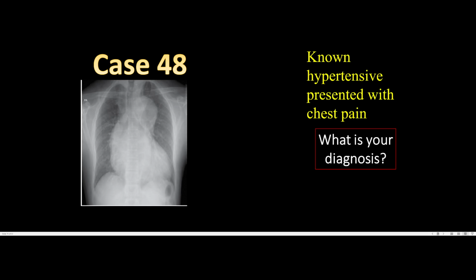So it's bleeding. You want to think of bleeding, something like aortic dissection. So in a known hypertensive patient presenting with chest pain radiating towards the back, with mediastinal widening, you might think of aortic dissection. You might think of pulmonary anthrax, a bacterial infection. For example, this is with diffuse mediastinal widening, and we talked about that from before.